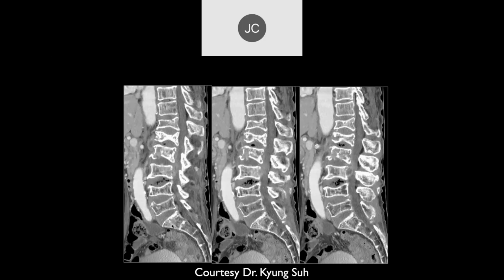Here is the CT scan. A lot of degenerative disease, but obviously multi-level compression fractures, interruption of the end plates, a lot of disc disease, and we can see a little bit of that soft tissue. So what would you think about here? A more atypical infection, if it's more chronic, like TB or fungal disease.